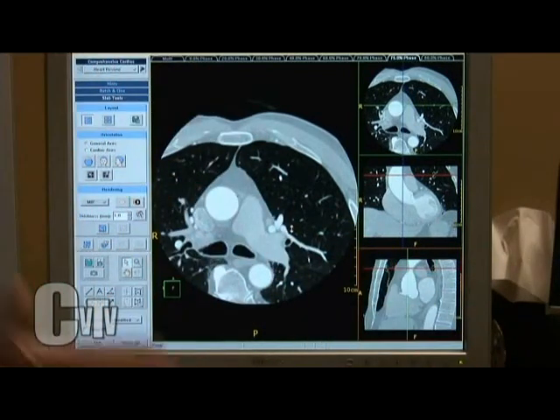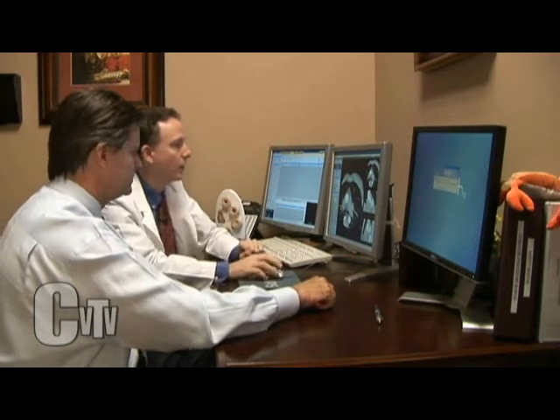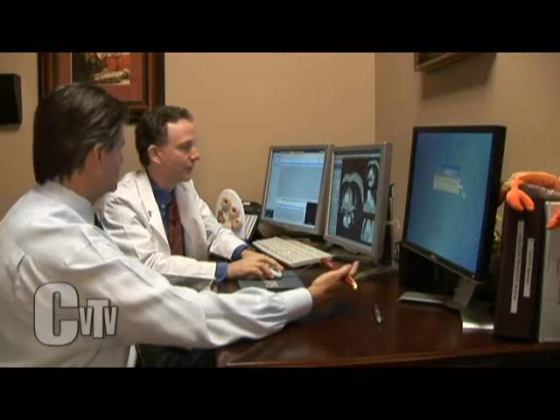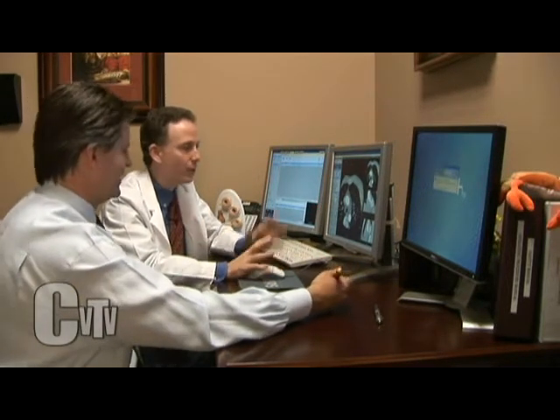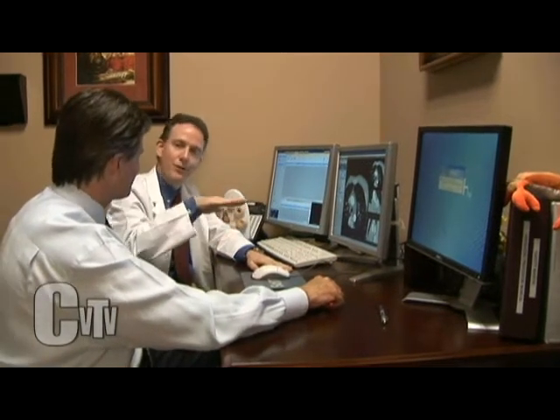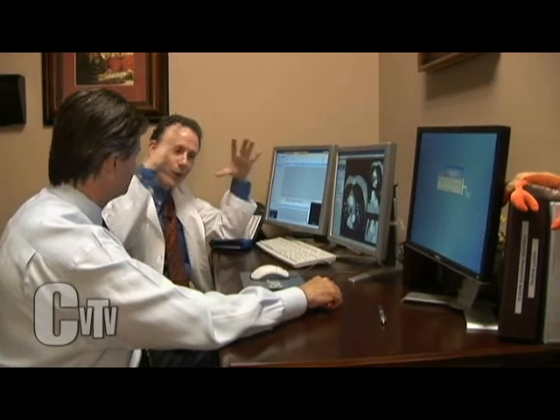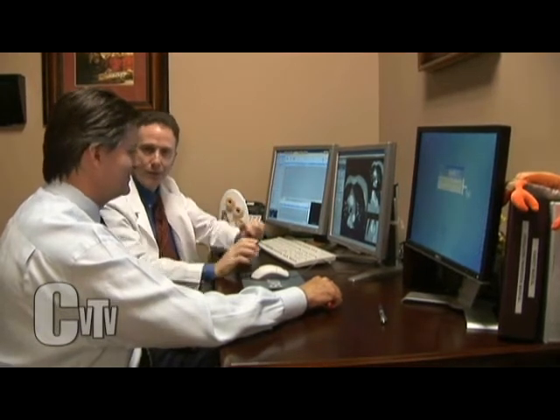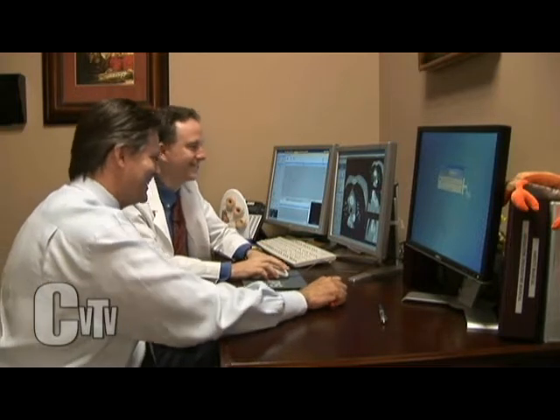Got it. Okay. Because when you do the scan, we actually get volumetric three-dimensional data, and I'll show you what it looks like. You've used the term virtual autopsy. That's what you mean. This is the virtual autopsy. It's like they're seeing inside of you without you, I tell people, dying. What does this really mean? It's the same as if I put you in a deep freeze, took a chainsaw, cut you here, took a big pineapple core, took a big chunk out of you. That's what we're exploring right now. I like the virtual autopsy word better. That was a bit graphic.